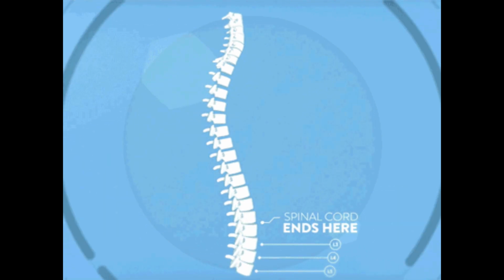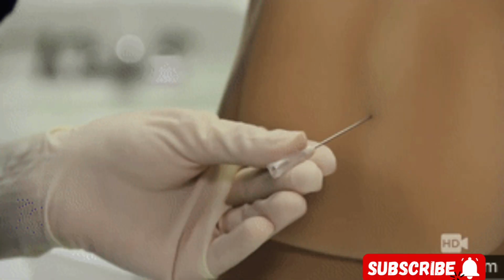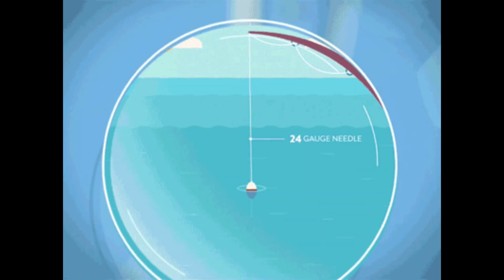Measure the pressure of cerebrospinal fluid, inject spinal anesthetic, chemotherapy, or other medicine, inject dye known as myelography or radioactive substance known as cisternography into cerebrospinal fluid to make a diagnostic image of the fluid.